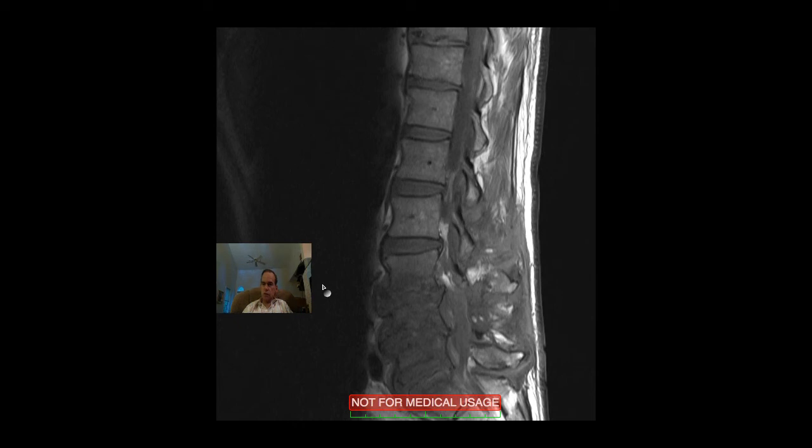This is a T1 weighted image without IV contrast, and it shows how much contrast can help with delineation of anatomy on T1 weighted images, which otherwise it's very hard to distinguish one thing from the next. But if you look closely, you can see a margin of what looks like this degenerated disc where it directly abuts the marrow substance of the vertebral bodies above and below.